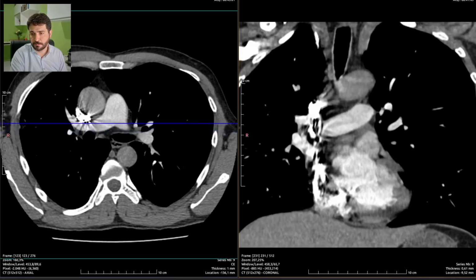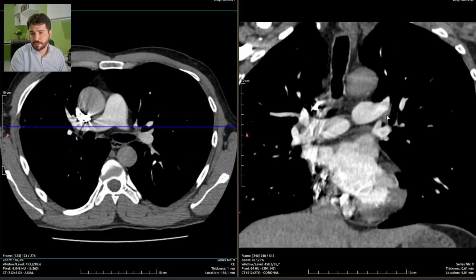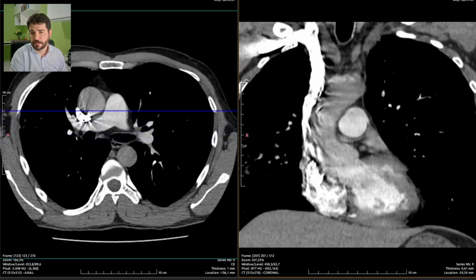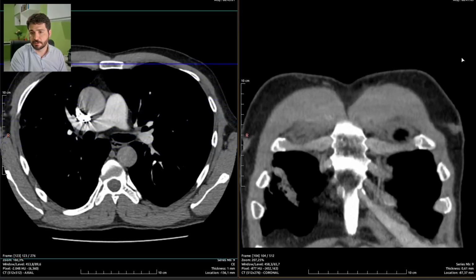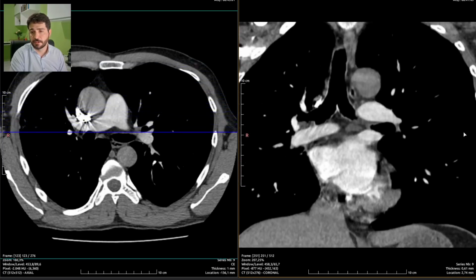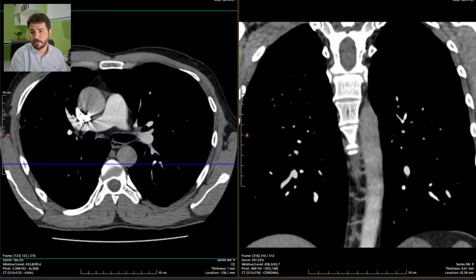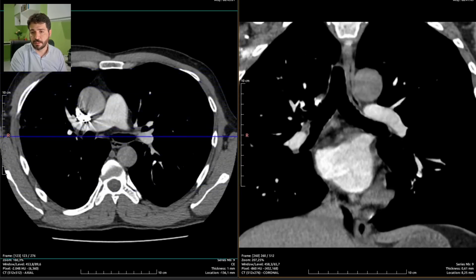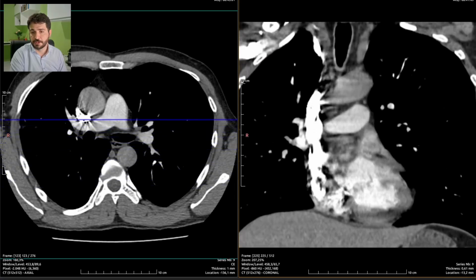So be aware that this kind of images outside the pulmonary arteries are just mediastinal fat and other vascular structures, and sometimes lymph nodes. This isn't thrombosis, this is normal. Thrombosis must be inside the vessels, not outside on the margin of such vessels.